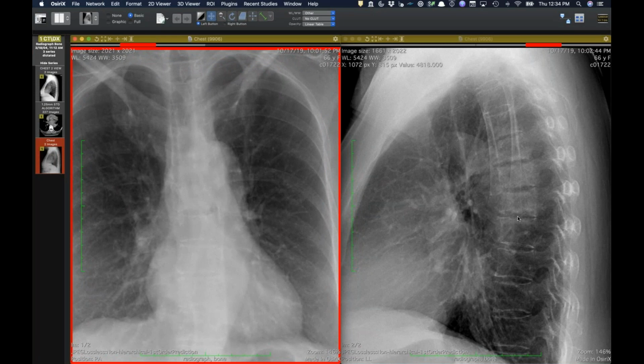Vertebral bodies behind there. Right, it's very interesting because it's like 4 contiguous vertebral bodies, and when you look, there's definitely increased density of those bones in general, and there's kind of loss of the normal cortical medullary interface that we see. That got me curious because, of course, a middle-aged or older female, you wonder about breast cancer.